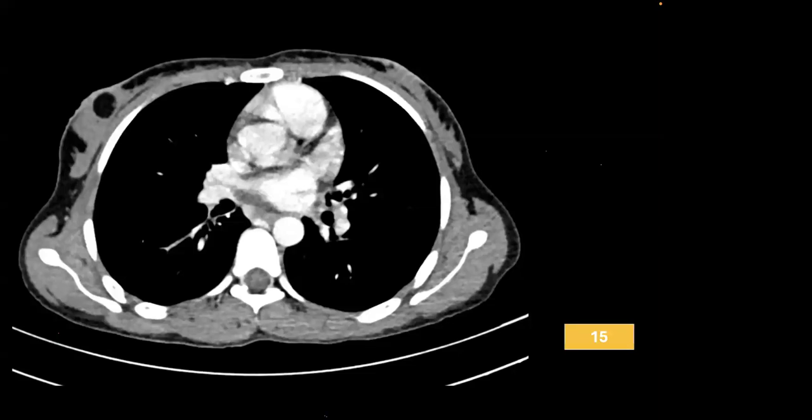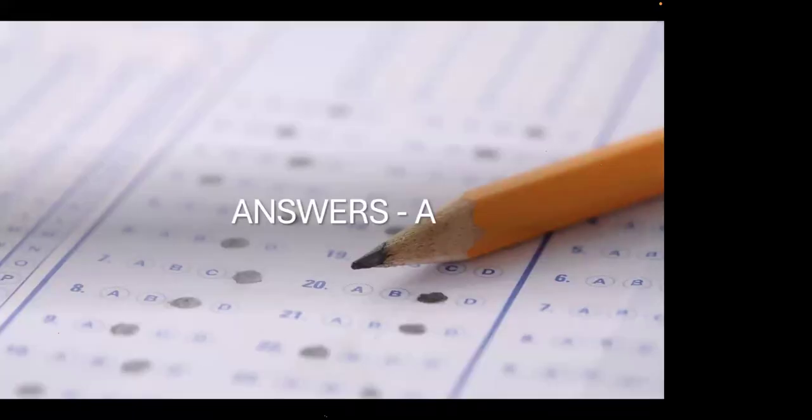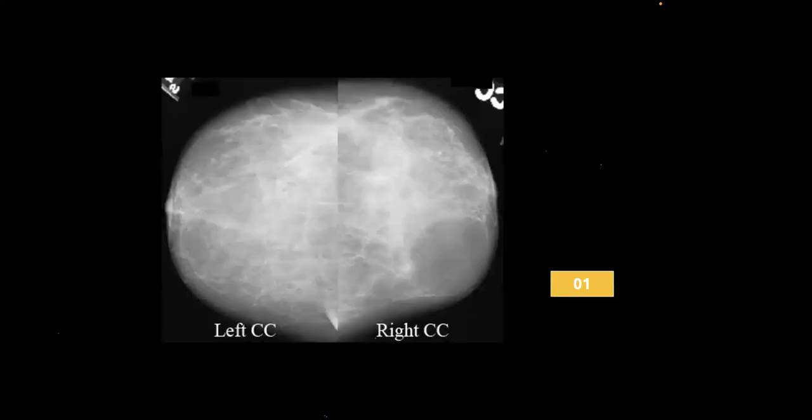So this first bundle was majorly for breast imaging. We'll look up to the answers now. What do you think was the first spotter? I cannot see the chat box. It is just adjacent to the sharing option. Okay, fine.